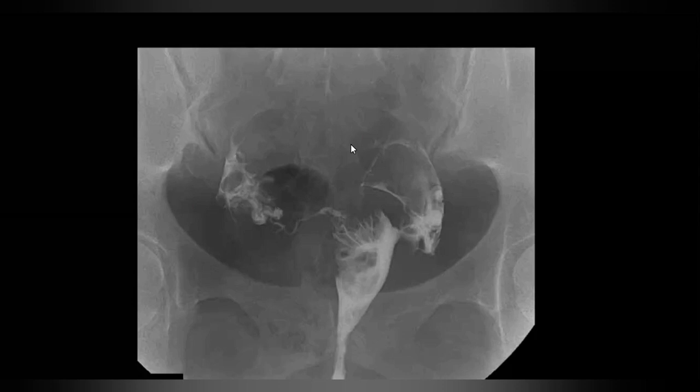This case was very challenging to us. We took her for ultrasound and we found significantly thickened endometrium. And looking at that with increased vascularity, we raised the suspicion for endometrial neoplastic lesion, and on subsequent histopathology, it proved to be such. So this needs to be differentiated from small endometrial cavity, which can be seen due to synechiae and multiple D&Cs, etc.